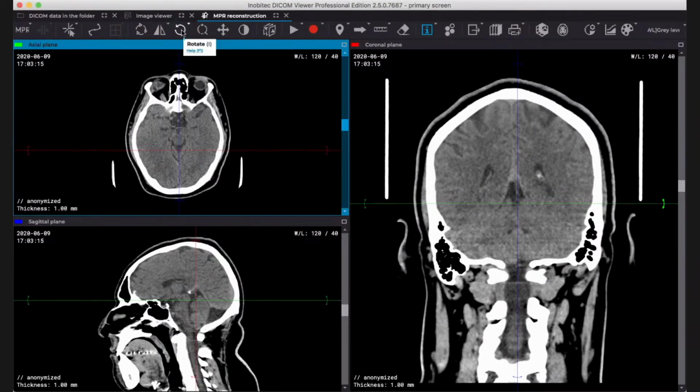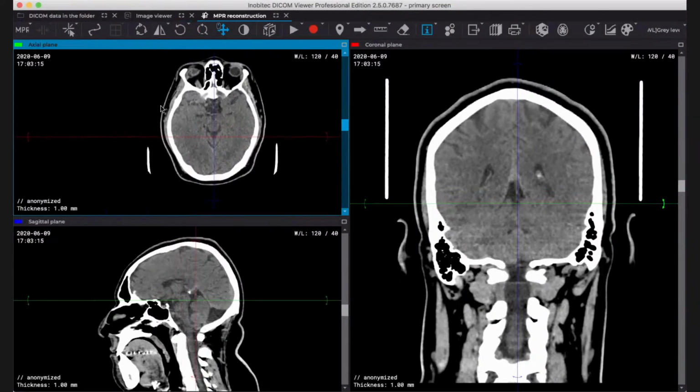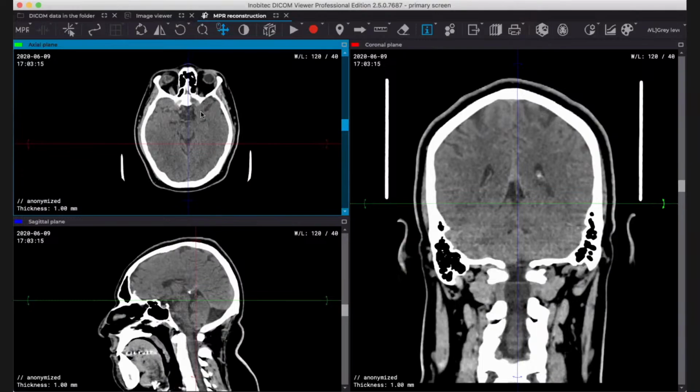Only by clicking over the icon with the mouse button that you want to set, it will be set. Okay, so I like to set, for example, my wheel to the pan. I just clicked over the icon with my wheel, and now this button does the panning function.